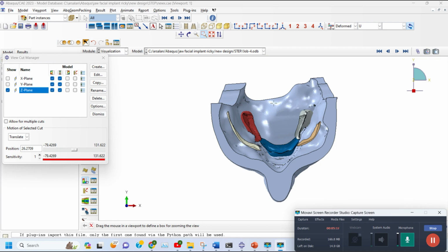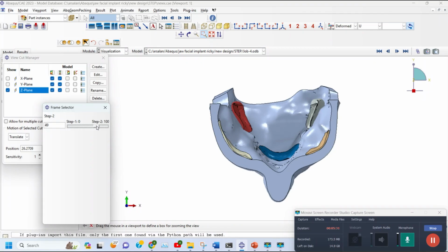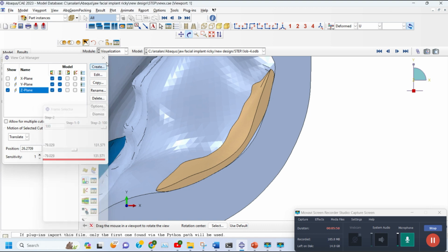In the second case, I'll be showing you the initial location of this chin implant. You can see over here the initial location of the implant where the surgery is done. When an inward displacement is applied, you can see it gives an initial sort of displacement or push to the face. In the first step you give the initial displacement to the implant, and in the second step an external force in the form of face pressure is applied so that the implant accurately fits the tissues, so there is no gap between the face and the tissues and the implant.